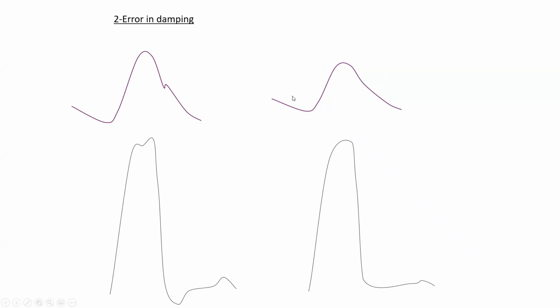This is an overdamped, or what we call damped, aortic pressure and damped LV pressure. So notice you have no dicrotic notch. The whole pressure is squashed down. Imagine as if you're grabbing the ends of this pressure and you're elongating it. Okay, you pull it outward. So it's squashed down and it loses all its dips and peaks and valleys.